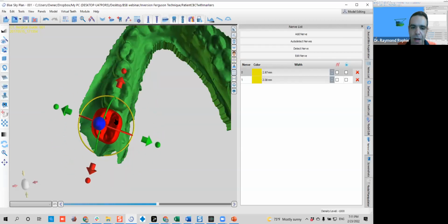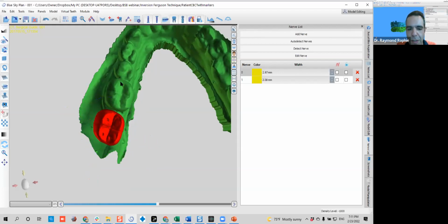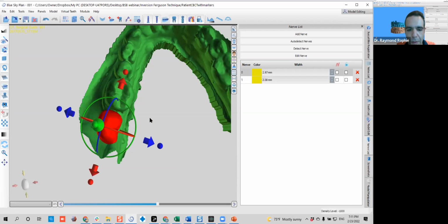In the courses that I lecture, videos, or if I'm doing clinical consultations in Lab Pronto, I suggest to only see one circle at a time, and just try rotating the circles that you can see. If you can see the full blue circle, it will give you full control of the rotation. However, if you try moving the red one, it's completely imprecise. If you did that, just undo with Control Z and it will help you.